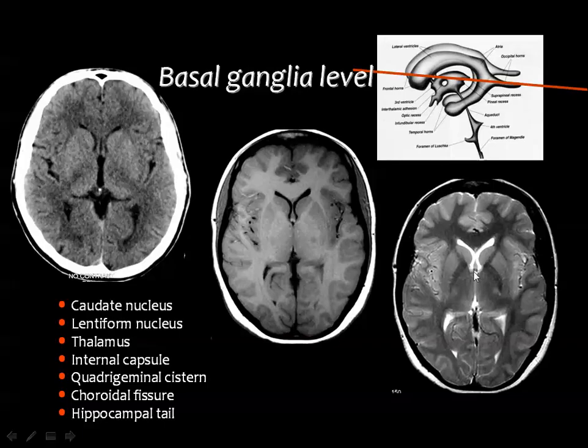The third ventricle is this structure lying exactly in the midline. Then this is the frontal horn, and this is the occipital horn, and this is the third ventricle. And anteriorly you can see sometimes a foramen, which is the foramen of Monro, opening between the frontal horn of the lateral ventricle and the third ventricle. And these are the sides of the foramina of Monro.